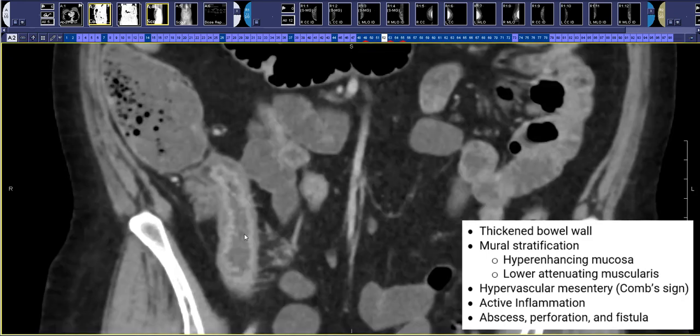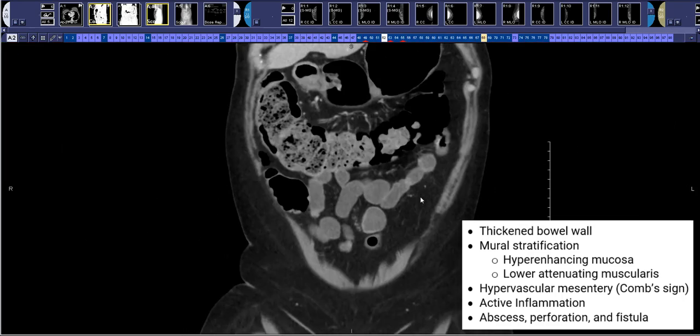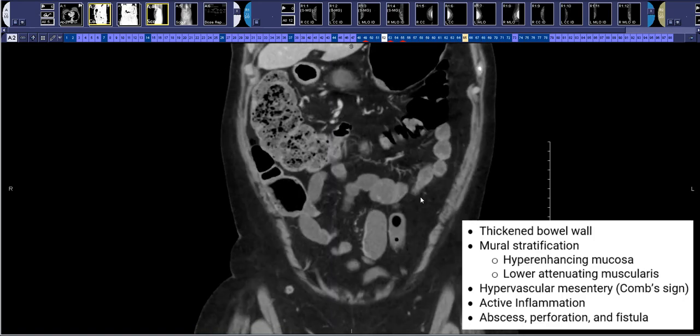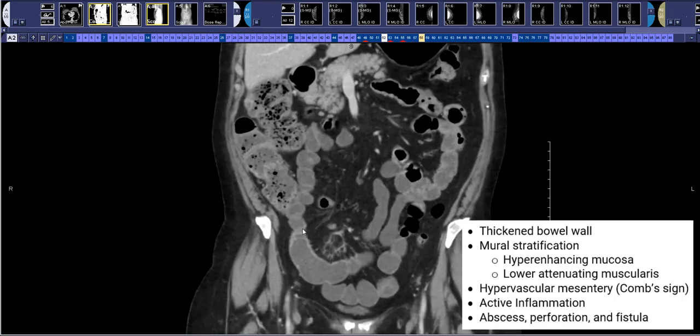In this case, this whole segment of inflamed terminal ileum was mildly narrowed, but the upstream bowel was normal caliber, so there was no obstruction. However, I'll tell you in clinical practice, it's frequently a cause of obstruction in Crohn's disease to have a narrowed segment of bowel with either fibrostenotic disease or acute inflammatory bowel disease that results in acute stricture, or in fibrostenotic disease, a chronic stricture, accounting for a bowel obstruction.